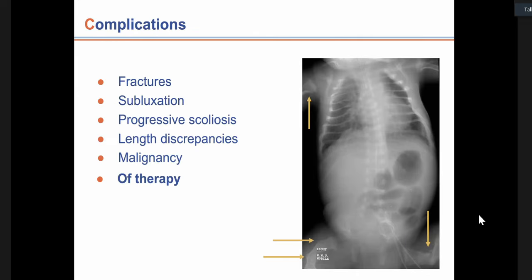And then the C complications, fractures are the commonest that we're looking at here in osteogenesis imperfecta. We've talked about subluxation, particularly C1, C2. We had the table in alphabetical order of the commonest conditions to give you C1, C2 atlantoaxial subluxation. We talked about doing dedicated lateral C-spine when you're worried about the C-spine. Don't look at the lateral skull.